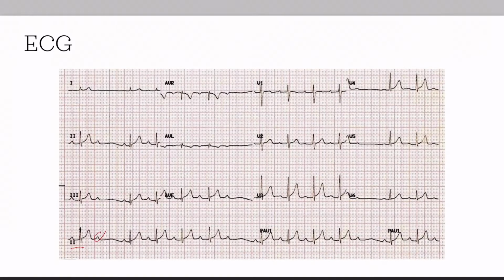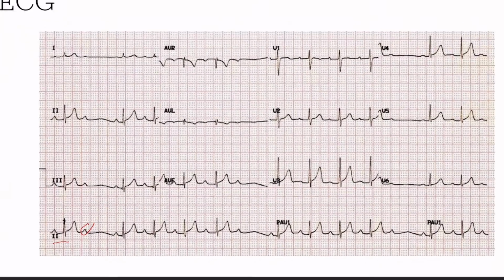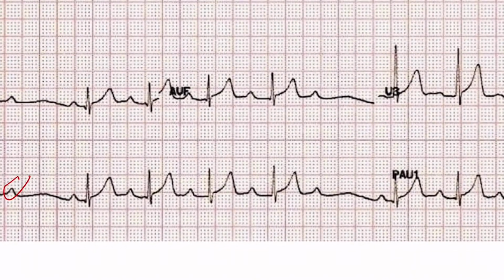So if we're looking for our PR intervals now, our first PR interval here, but then we've got this P wave without a QRS complex. So if we zoom in, we're going to look at the PR intervals in this little group of beats here. So first PR interval looks to be about normal, probably around 180 milliseconds. If we move on to our next one, we've got that, that, and that. And if you look, it looks like we're actually seeing an elongation of our PR intervals. So we're going to go ahead and call them varying for now.